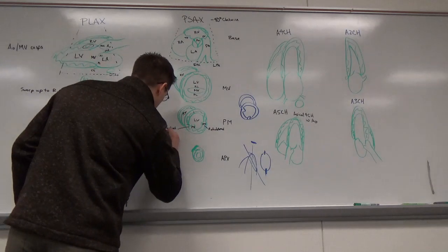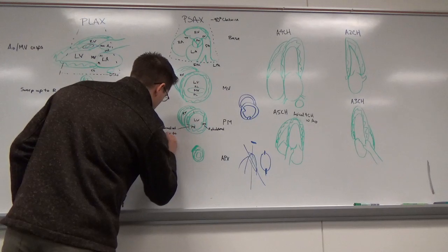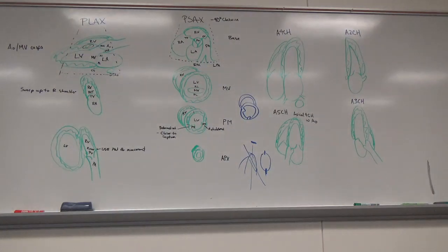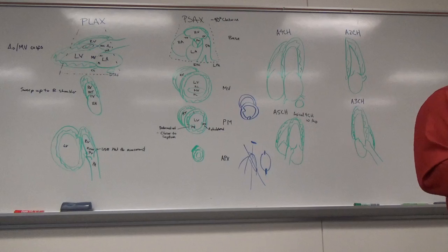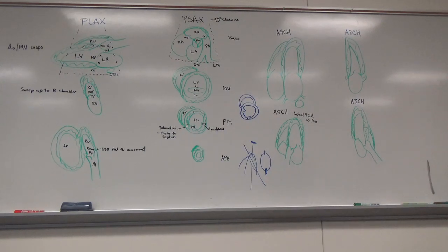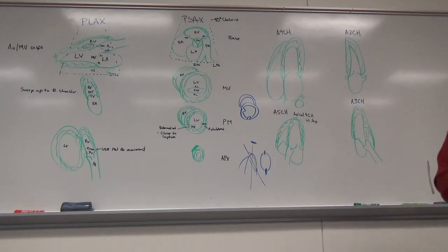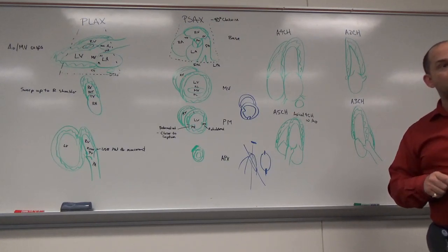When you're talking about the sections on the mitral valve level, how the top was anterior but the bottom was inferior? Yes. Why is it not posterior and anterior? It used to be. So the terminology has changed because of the 17 wall segment method we use now. It seems to not make sense, but it actually does. There's some logic behind it.